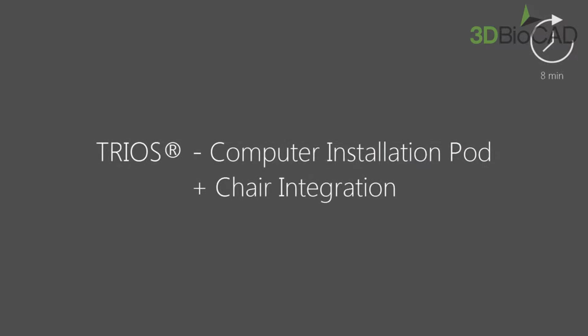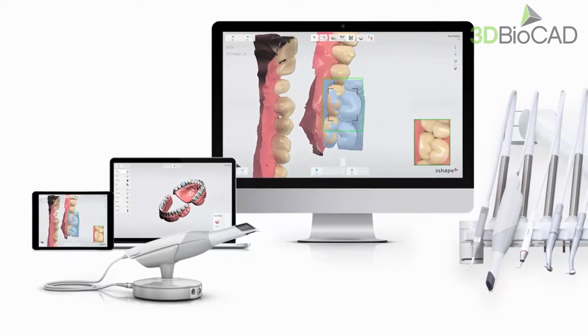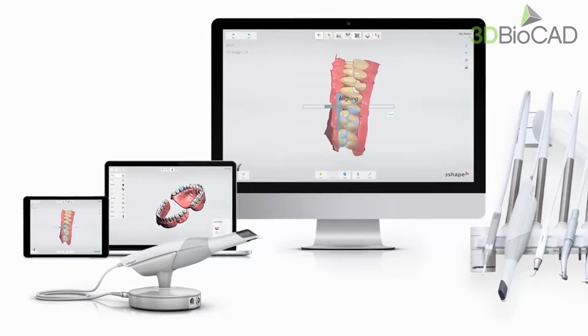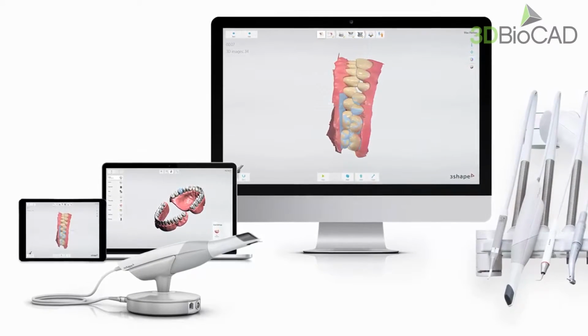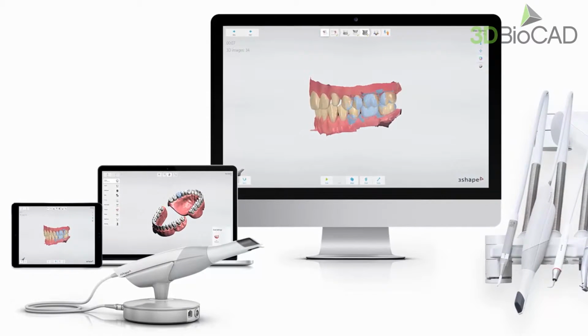In this video, we will show you how to set up a new PC, install the TRIOS software, and integrate devices together. With TRIOS Pod, you have your entire clinic always at hand and can enjoy its functionality on a Windows PC compatible with our requirements and on any iOS or Android device. As the PC's specifications and configuration affect the TRIOS performance, 3Shape will only support TRIOS usage on approved PCs.